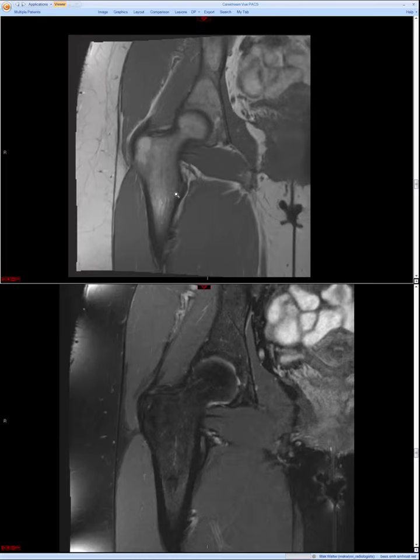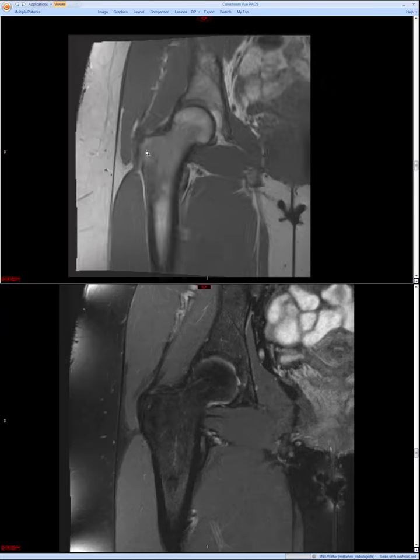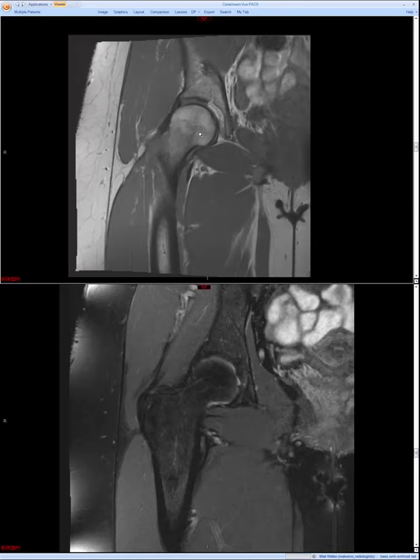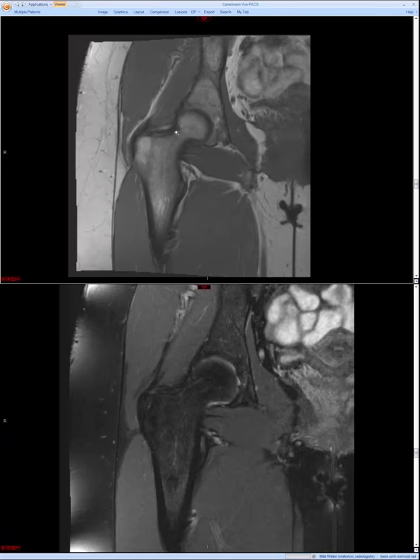Notice how also, when we go to the greater trochanter, which is an epiphyseal equivalent, we actually see just bright fatty marrow. So this is all yellow marrow. And when we look in the capital femoral epiphysis here, nice yellow marrow, so it's bright. And so we see this marrow here, and we ask ourselves, is it darker than muscle? No, it's not.